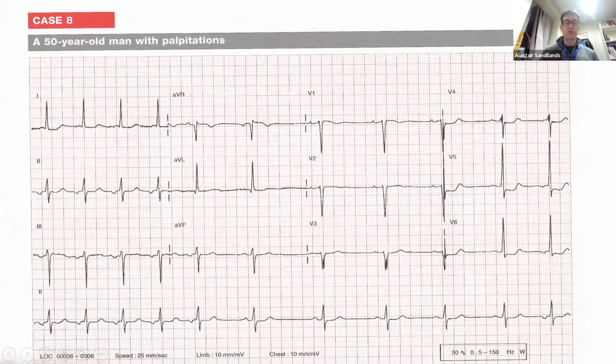Ectopic means coming from a different source than the sinus node. We can say that is the case because it's a negative P wave, and it's just 1, 2, 3, 4, 5. Heart resets itself back to sinus rhythm, sinus rhythm, sinus rhythm, sinus rhythm, negative P wave again. So ectopic beat there, just one beat before the edge of the ECG. So this is what we call an ectopic atrial rhythm, or 5 atrial ectopics together. It's not particularly fast. It's not really a tachycardia by definition because it's less than 100 beats, more than 3 large squares, but we call this an ectopic atrial run or ectopic atrial rhythm.